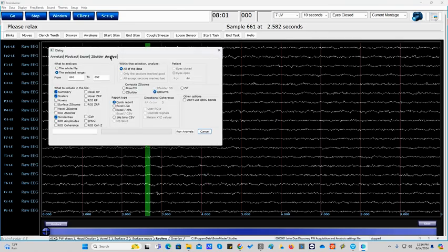And then I'm going to say analysis, the whole file, all of the data, Excel, XML. And then if you have not purchased S-Loretta, you click the four S's: summary, scalars, surface, and similarities. As soon as you click surface z-scores, you'll notice the age comes up. If the age is wrong, I'm going to fix it right here. But since I have S-Loretta, I'm going to click voxels, voxel z-scores, ROI z-scores, and ROI amplitudes. And now I'm going to click run the analysis.